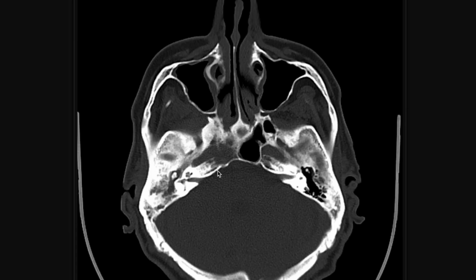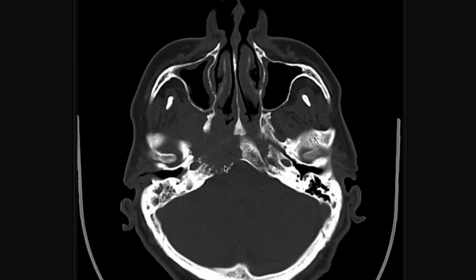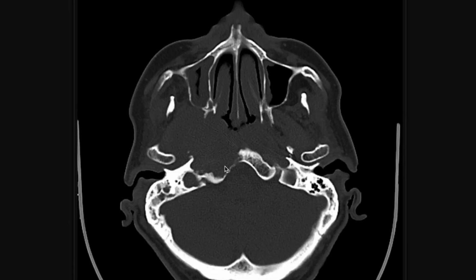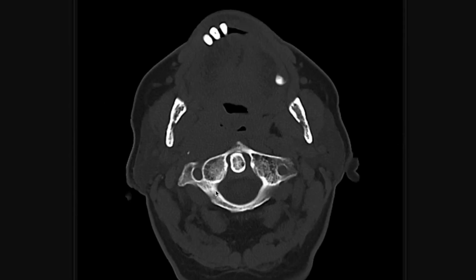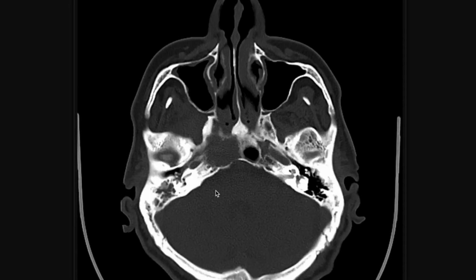And we can see that the clivus and the apex of the petrous have been eroded by this mass. And we will check more inferiorly actually to check if the occipital condyles have been affected, and obviously fortunately they have not been affected, and the atlantoaxial joint seems very, very well. And obviously we can see that the eustachian tube has been blocked in the path of this mass.